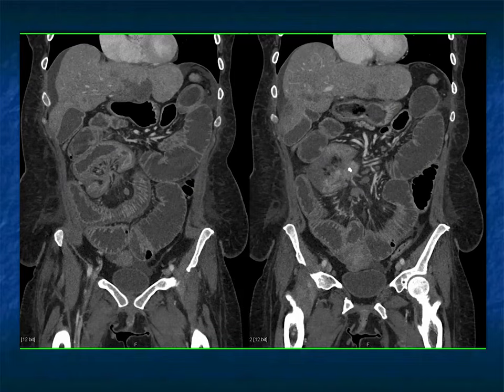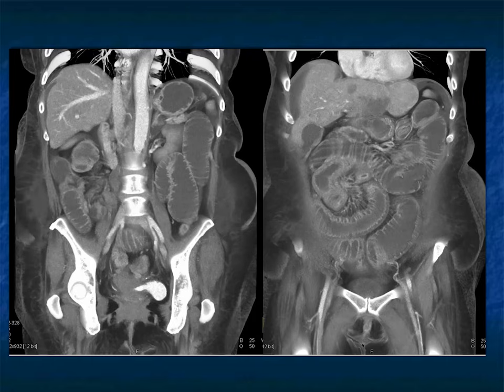Primary tumors from carcinoid not always are going to be vascular, but you can see, look how edematous the bowel is. Now, it's interesting with carcinoid, it doesn't necessarily mean the bowel is ischemic. Often the desmoplastic reaction will cause this thickening and edema, and I surely would worry about ischemia, but usually these patients are followed, treated with chemotherapy, and typically do not cause perforation or obstruction.